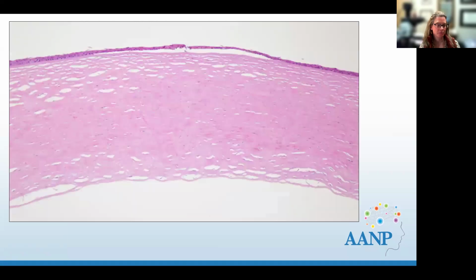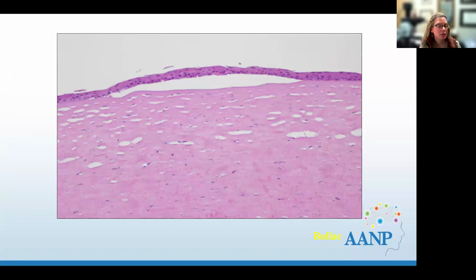than others. And so if you look in the stroma, you see that the epithelium is intact here. There are some subepithelial bullae, meaning there is some edema within the corneal stroma. And we'll talk more about that as we get to bullous keratopathy. And if you look within the stroma, you see the little red particles that are within there. And if you get closer, you can see them here. There's a bullae showing that there's stromal edema, where the epithelium pulls away from the basement membrane because of edema within the stroma, that water barrier has been broken.